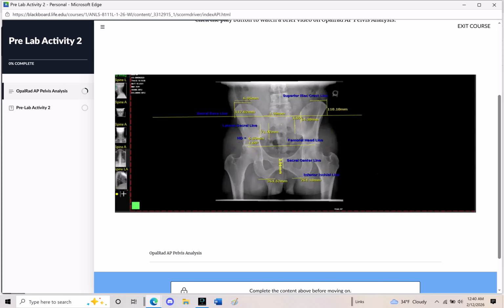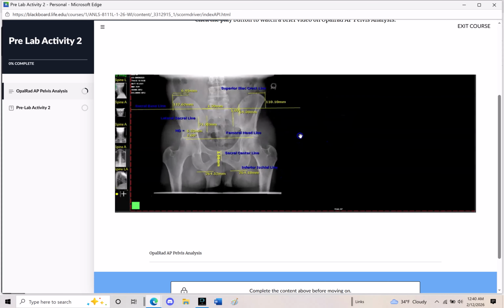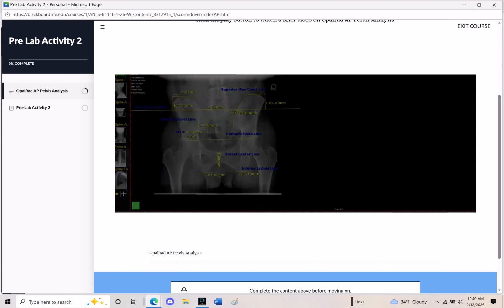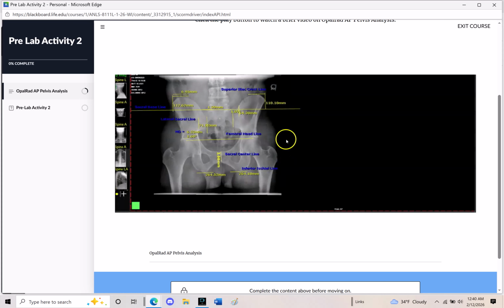So we're ready to capture our screen. So we're going to pull this over here close to our patient's name. We're going to click Shift, Windows, Picture, and S. That gives us our little identifier mark here. Our right side, all of our lines, our numbers, our labels. Release, screen capture. Good. And we'll save that in our folder so we can upload that for our final practical.